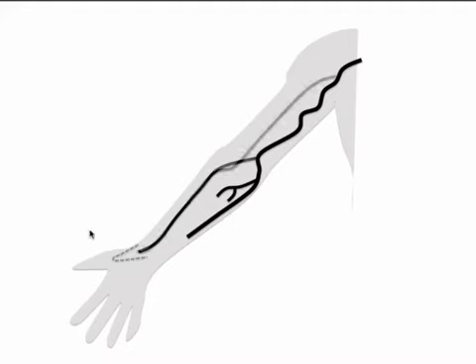But sometimes you get this. Well, what's that? This is a so-called high takeoff of a radial artery. It's seen about 5% of the time. It doesn't really mean anything, except it can be shown to you to trick you. A piece of trivia is that if you're doing radial access, which you can do, it does not affect your ability to access it. It doesn't matter. You can access it just the same as you would normally if you were choosing to do so.